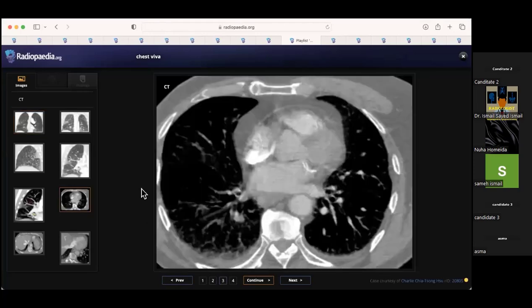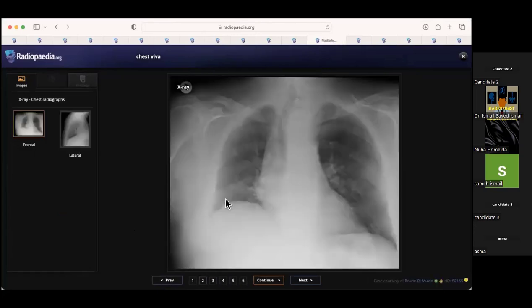They're just static images, but it's not clear. Usually with diuretics, they repeat the X-ray and it's completely normal. Okay, so with an interstitial UIP pattern, we said it would be bilateral, isn't it? Yeah. I'm giving you this one, so I think they're a bit difficult cases, but yeah.